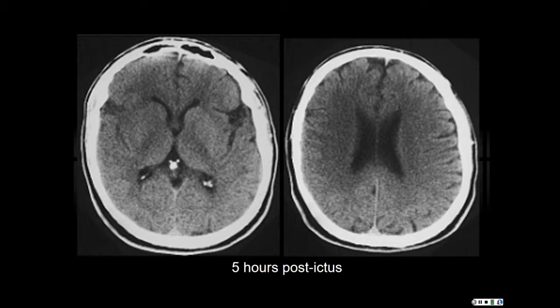ICA, MCA, PCOM. I'm missing the A1 segment here, by the way. A1 segment is down here. Lenticular striate branches.